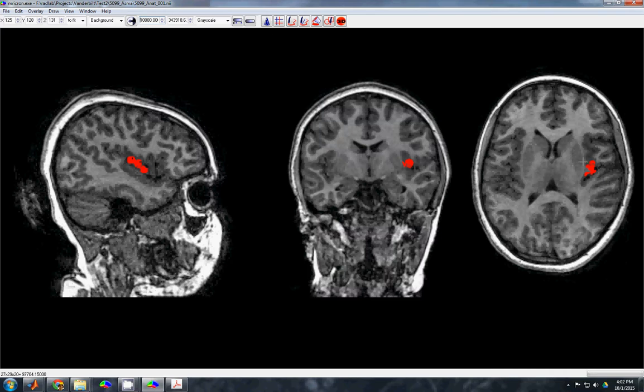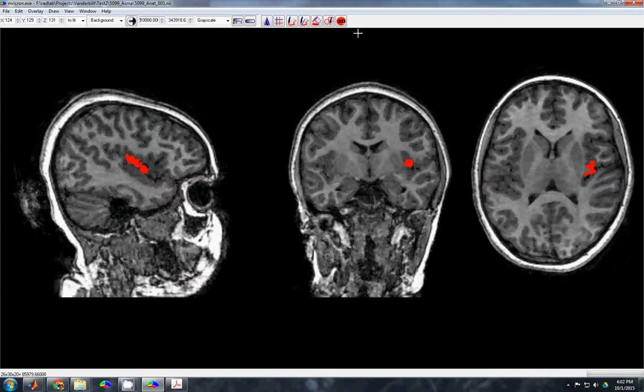If you ever think something's going too far, you can click the drawing tool and hold shift to actually erase bits of it, just for touching it up. So I'm holding shift while I use that pen tool here to do a bit of erasing. I think it's overstepping its bounds a little bit. Okay, most of that stuff will cancel out as we average across raters. So just do your best. I'll go back to the 3D tool. Cancel. Okay, so it looks good.